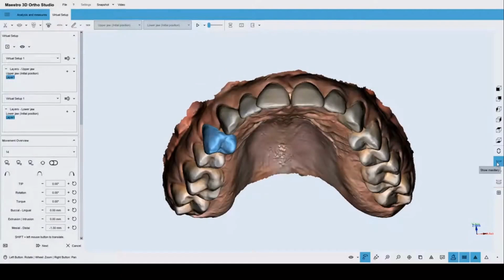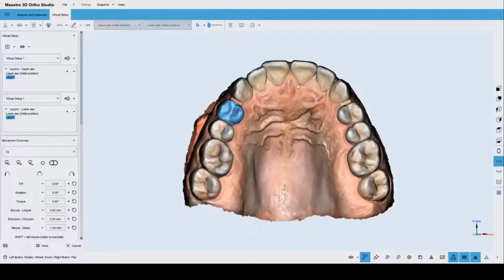of the software. So just let me show you, for example, what we have made now. So you will be able to see a first animation of our movement. I have started, as I've told you, doing a distalization. I can also rename this first group of movement, just clicking here and assigning a name to my movements.